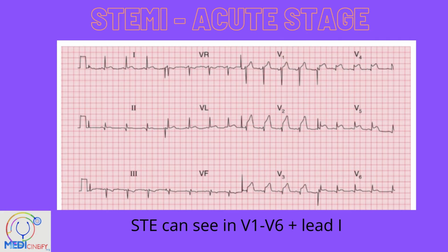STEMI, acute stage. Another example. ST elevation can be seen in V1 to V6 plus in lead 1. Please refer to the circles. You can see V1 to V6, prominent ST elevation, and also a little ST elevation in lead 1 as well.